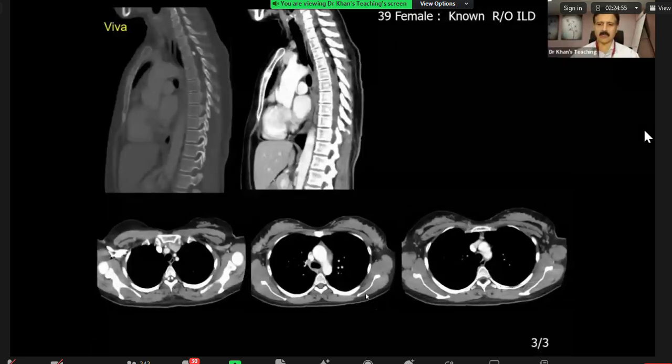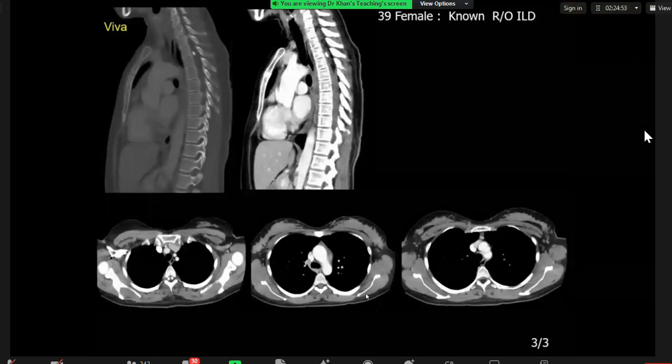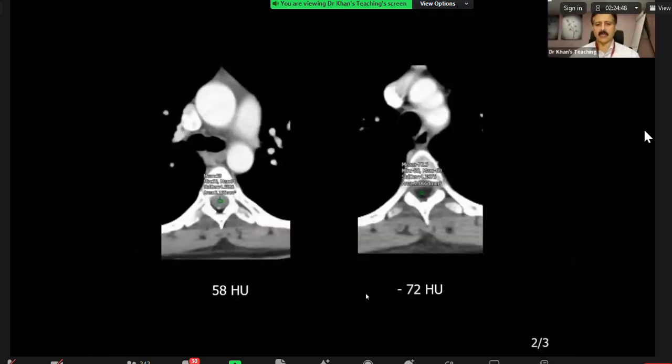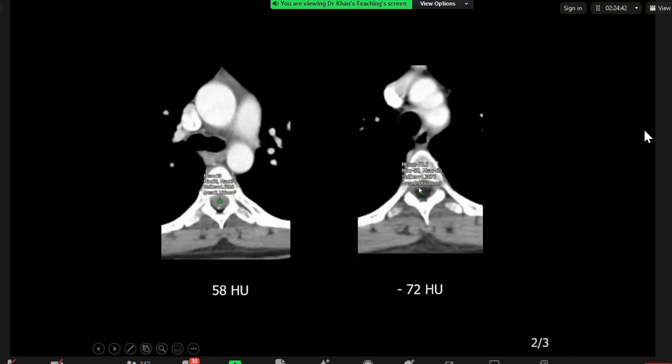Is there fat inside or not? I could do a region of interest. So that's a classical scenario, and you have to tackle it like this. And what is here? It confirms my suspicion, so it's -69, consistent with fat Hounsfield density. But not completely fatty. You have already seen calcification, and there is some soft tissue also there, right? So what comes to your mind?